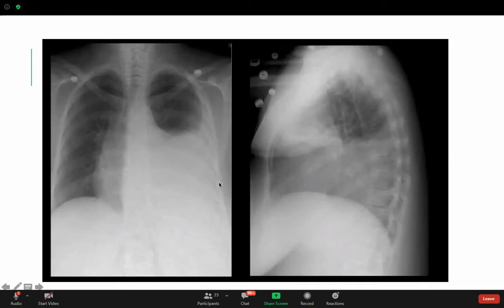Someone mentioned tension pneumothorax. Where is the pneumothorax? So what's the color of the pneumothorax in a chest X-ray? Is it white or black? Black. And here we see whitening. So it's unlikely to be pneumothorax, okay? And someone now mentioned also pleural effusion. I think someone mentioned it before, but we didn't reach it there. Excellent. So possible pleural effusion.